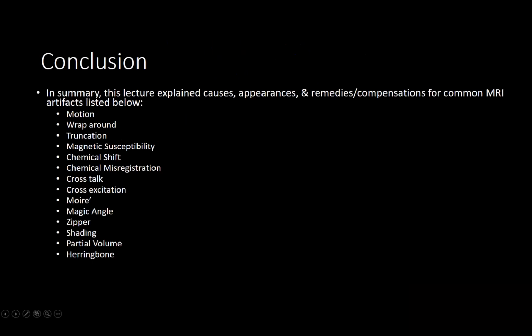In summary, this lecture explained causes, appearances, and remedies or compensations for common MRI artifacts seen in the clinical setting.